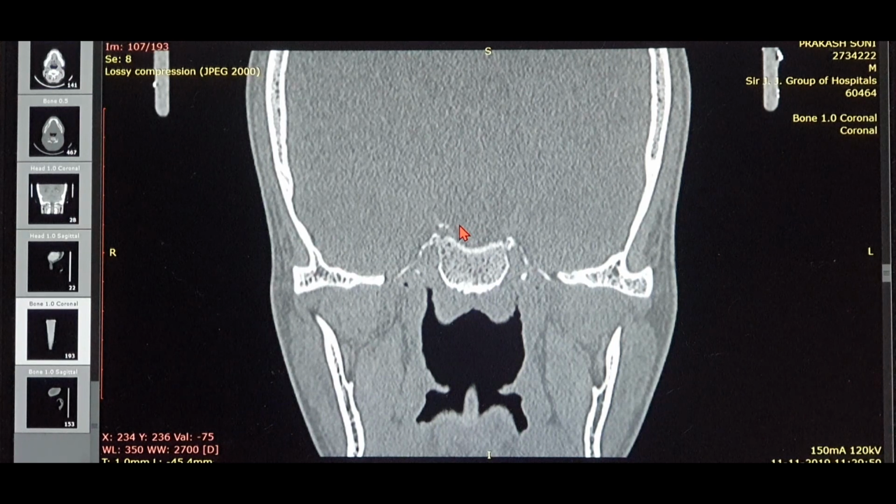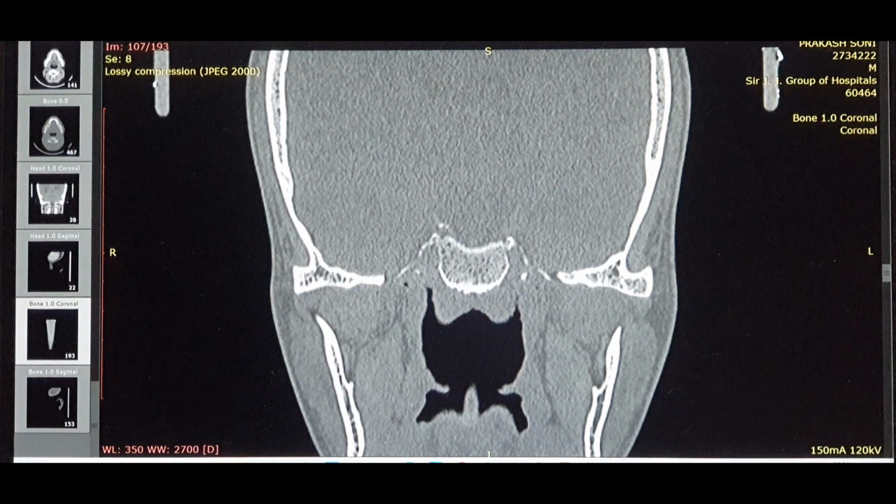Similarly, the way you saw the MRI, the same way you will see the carotid artery in the CT scan, which is a contrast enhanced CT scan. And that too offers a soft tissue window, because if you ask for a bony window, you will not be able to get it. So you need to ask for a post contrast CECT neck and PNS with a soft tissue window. Okay, so that is how you can locate it on a CT scan post contrast.